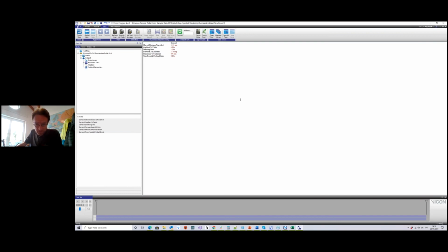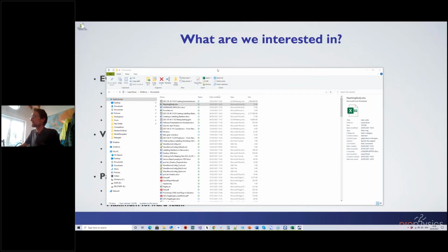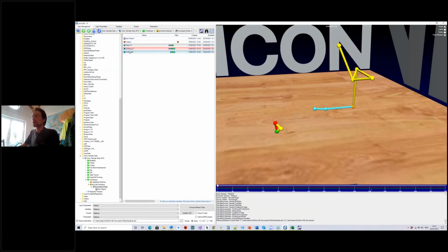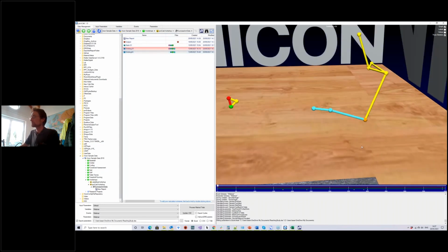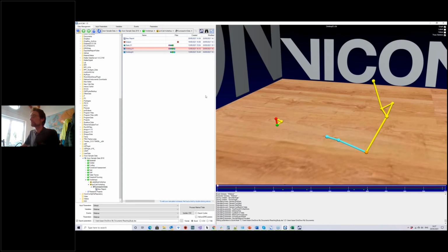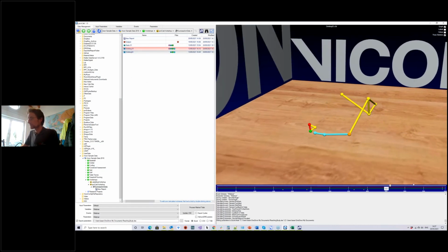What happened in the drinking 02 where it detected the same event twice? Yeah, that's an excellent question. I was hoping that somebody might ask that question. And of course, what you can do is just have a look. Was it 02 or 01? Okay.